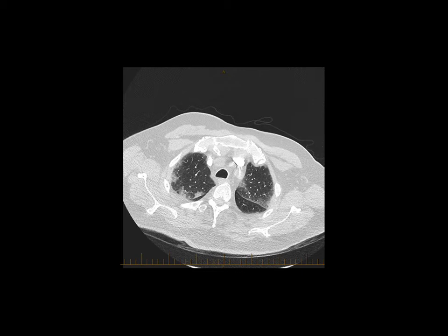Post-discharge, he had a CT chest. So I just put up some images of that so that we can relate them to the ultrasound changes as well. You see that these are the changes that we see on the ultrasound as well. So ground glass opacity, alternating with normal lungs, and then a little bit of consolidation there.